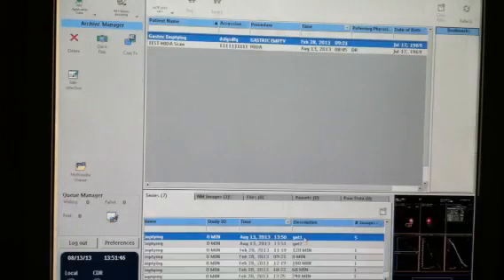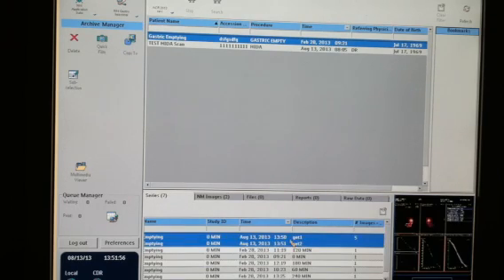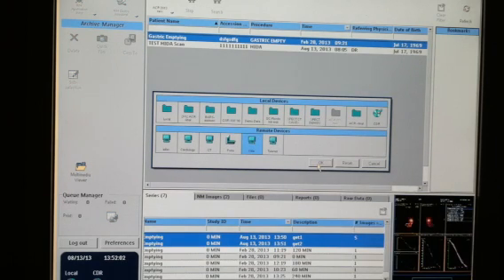Alright, so from here, we're just going to send over the 2 files here. Because we don't need to send the raw data on these. So just hit Control, and click on these 2, copy to, eyesight, and click OK. And that's a GET for you.